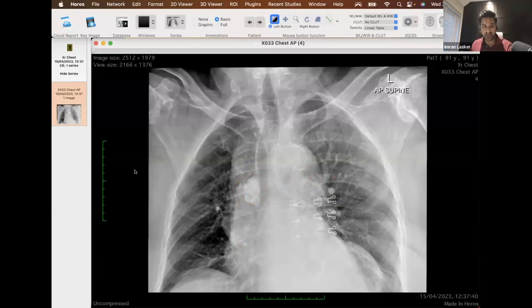So what caused that? Rheumatoid arthritis doesn't usually cause calcified lesions, right? It would maybe cause cavitating lesions on some occasions, but not calcified. The other ones can cause calcified lymph nodes: sarcoid, silicosis, lymphoma, especially if it's treated lymphoma. Lymphoma doesn't initially cause calcified lymph nodes, but in some situations it can, where you get calcified lymph nodes after treatment, right? So this looks like a single calcified lymph node.